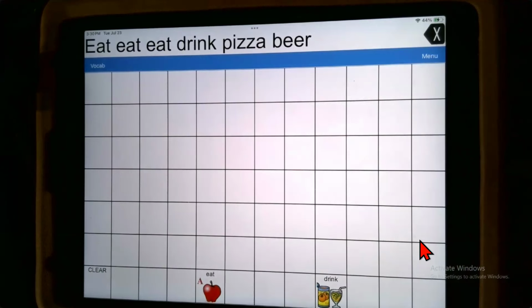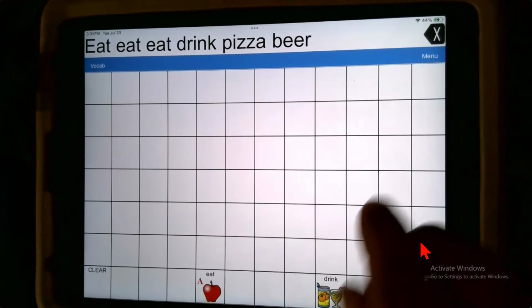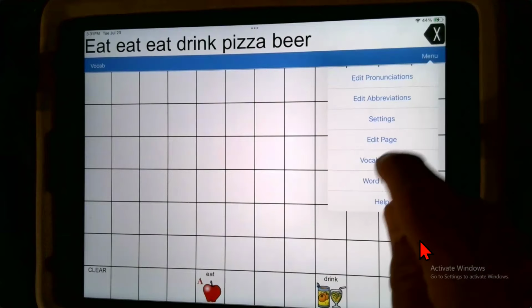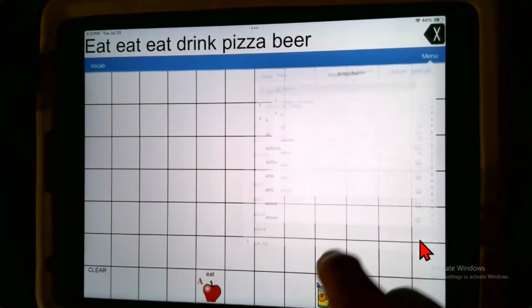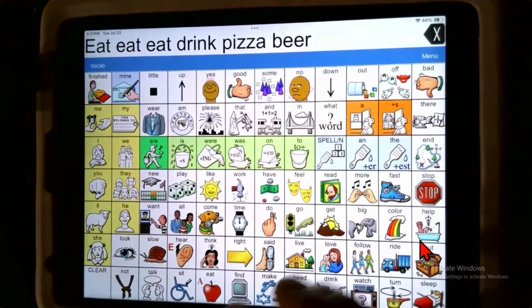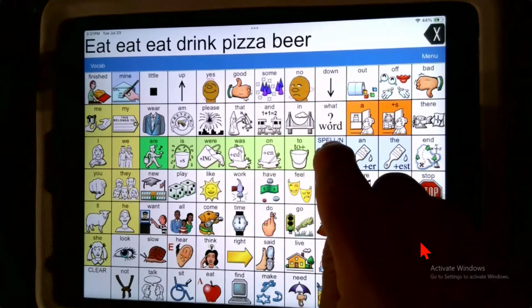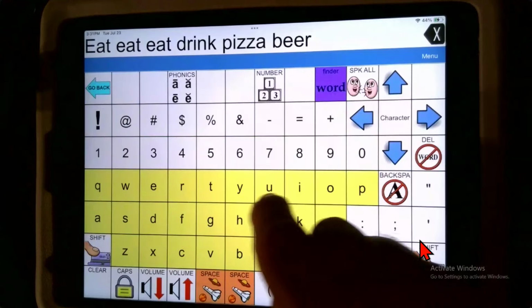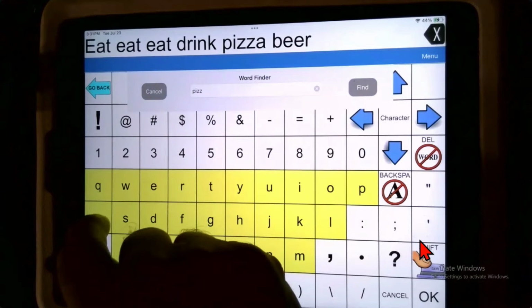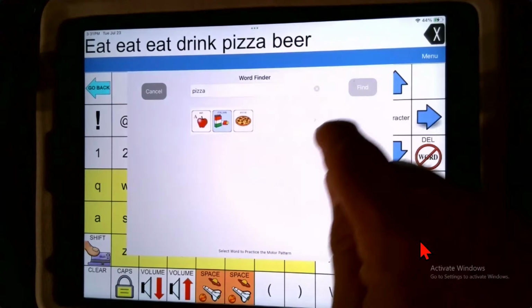All right, so that's Vocabulary Builder, and you learned how to toggle it off and on, and I've encouraged you to use the device over the top. Remember, Vocabulary Builder has this toggle, which lets it turn off real quick. After a few hits, go back to everything showing. If when you bring everything back showing, they crash, then go back to your Word Finder and see what happens when you use Word Finder. See if pizza works now when you do find.